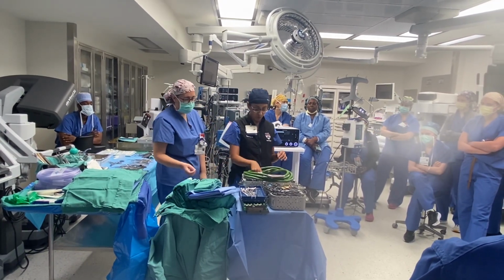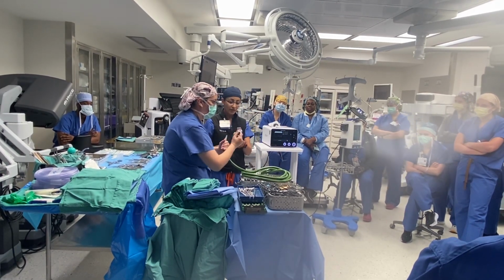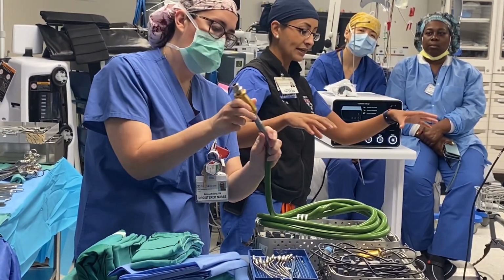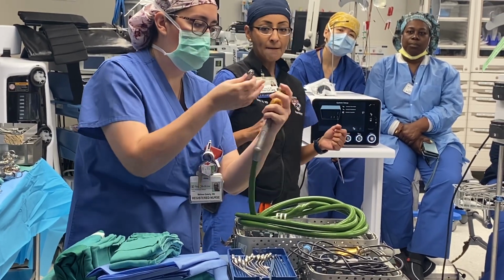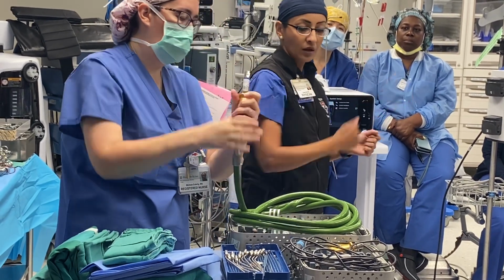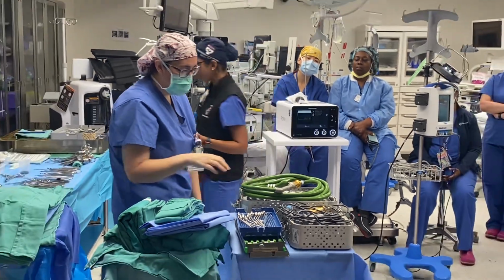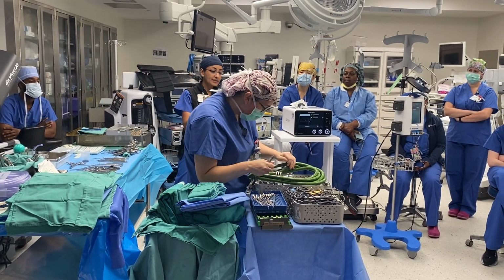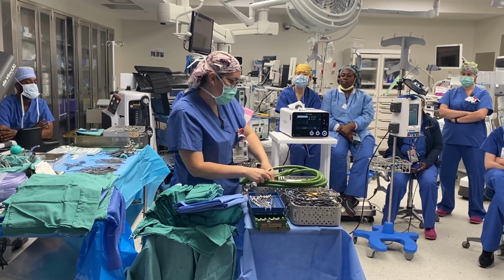So usually what we will start with is the perforator. And that bit is going to allow us to create something like 3 to 4 burr holes on the head. So we will have this all set up, and then we're going to go sequentially across that and drill our multiple holes. Then we'll use the curette, which is on your set, to take away, there's always a little bit of bone chip sitting in the area that we drill, so we'll peel that away.